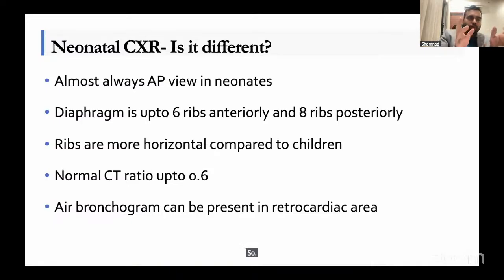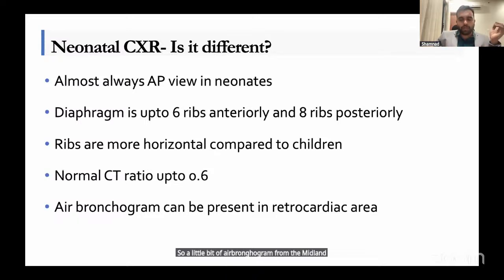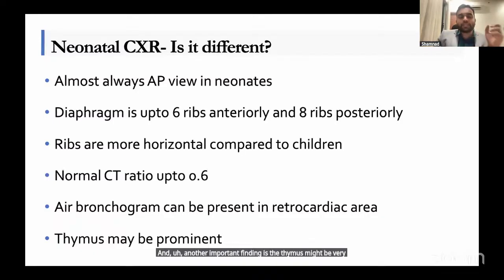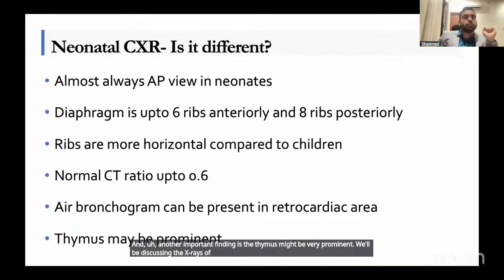So a little bit of air bronchogram from the midline till 1/3 is normal. Okay. And another important finding is the thymus might be very prominent.